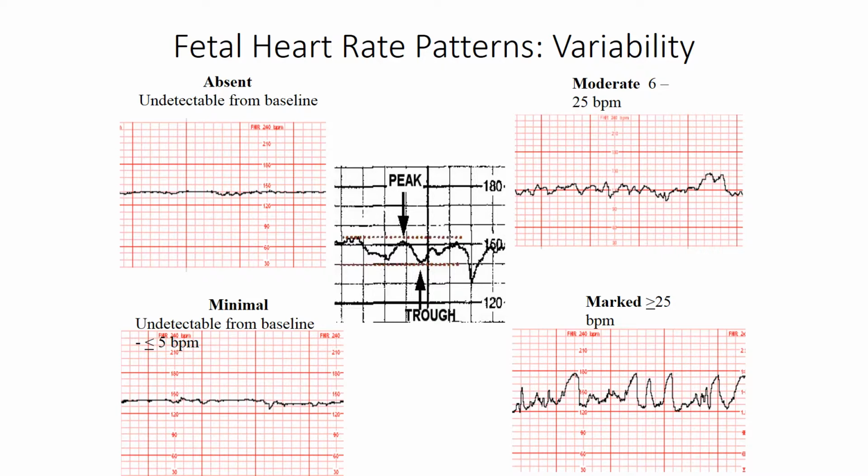All right, but here we could say that the baseline range on this marked is 130 to 145, but then you see up and down, up and down, up and down, up and down. That's kind of an ominous sign. That means that fetal hypoxia probably has just occurred. So we're going to watch this very, very carefully.